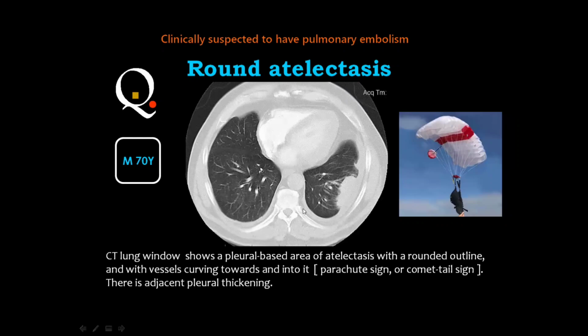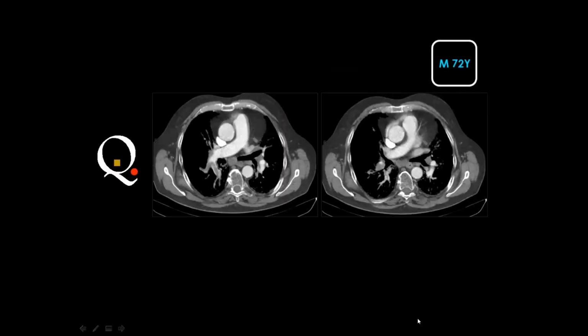And you should know that these lesions on PET scan will show metabolic activity. And that's why I receive many cases to have a biopsy from this lesion on the assumption that this is a bronchogenic carcinoma. And I say this is round atelectasis because of the very characteristic appearance, but some of the physicians insist on taking a biopsy, and the biopsy results will be an atelectatic lesion.